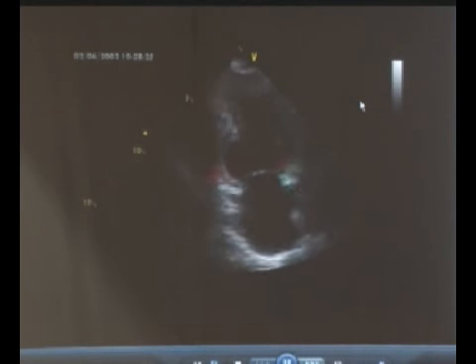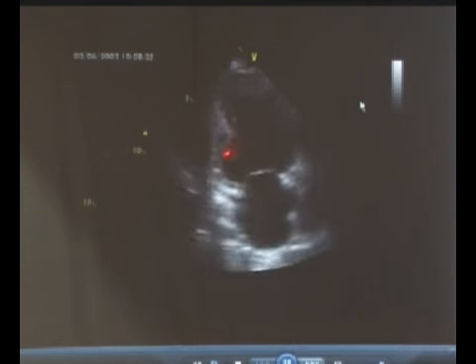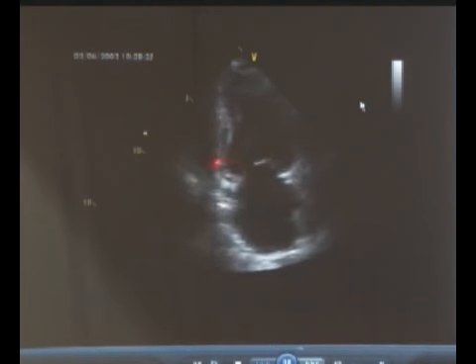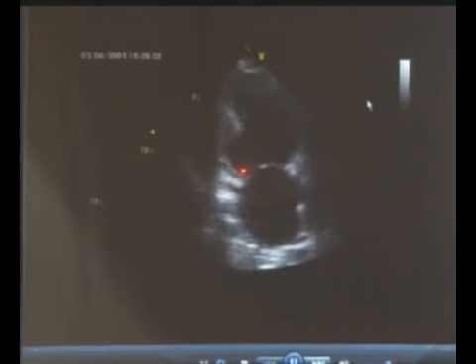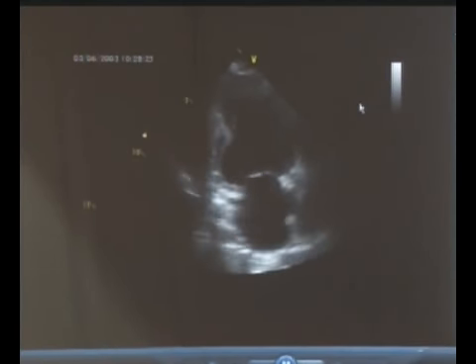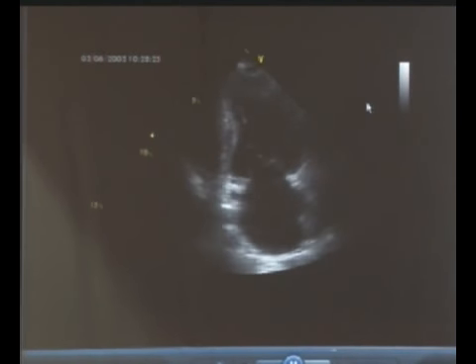Second most important thing, if you look at this, there is no endocardium seen over here. Look at this endocardium over here. There is hardly any endocardium seen over here. What do you mean by that? It's thinned out. If you measure, it will be almost 6 millimeters or less than that. Which segment will become dyskinetic? Which is a dead segment.